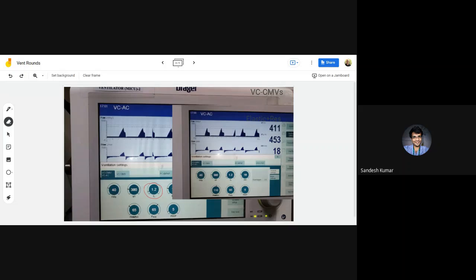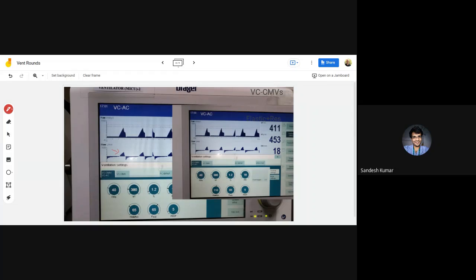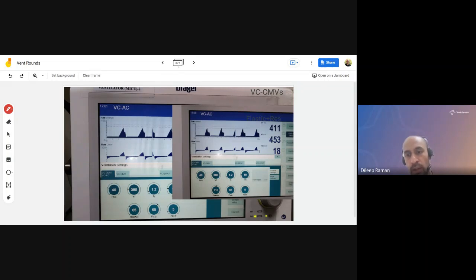So here the vent is actually controlling the pressure, thereby indirectly affecting the flow. It's not directly changing the flow. You can see that here very clearly. What it is changing is the speed with which it's pressurizing the circuit, and that's the reason why it has indirectly changed the flow. I just wanted to make that clear. So absolutely, it's not the flow which the ventilator is controlling here. It's absolutely not the flow. And we have mathematical proof of that, and the manufacturer themselves are saying that.